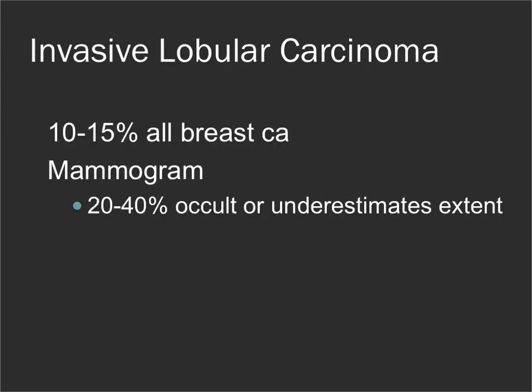Now, what about invasive lobular carcinoma? This is a smaller percentage, about 10 to 15% of all breast cancers. And we know that the mammogram underestimates a significant percentage of the disease extent in invasive lobular carcinoma, or it may be completely occult mammographically.